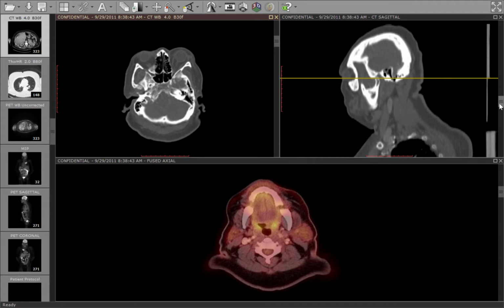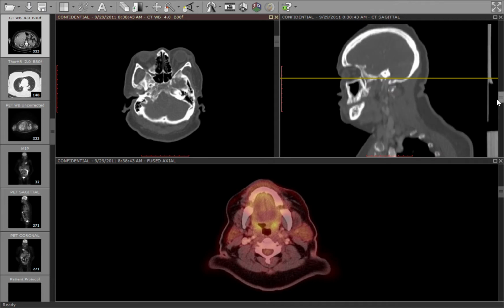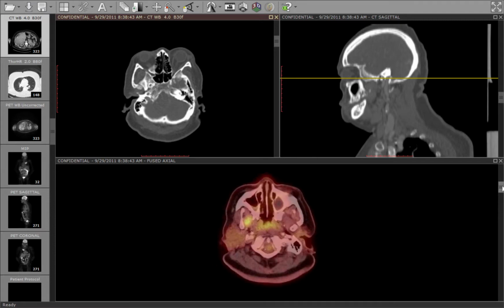This patient, you can see, has no teeth. And subluxations or dislocations are very common in patients without teeth because they don't have a reproducible bite. So you don't get the same muscle memory that people with teeth have, where the teeth fit together nicely. It kind of provides a nice stable position, and the muscles just tend to bring the jaws into that position. But the other reason to have a subluxation is if you have abnormal activity of one of the muscles that opens the jaw. And the main opening muscle of the jaw is the lateral pterygoid.